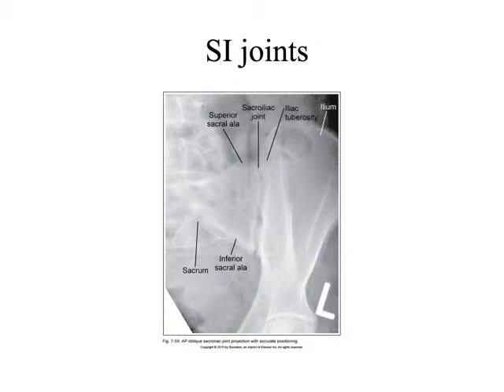In terms of this left SI joint, where is it at on the image? Can we point it out? Yes, you can point it out, but then use your words to tell me where it's at on the image. It's centered on the image. Thank you. Good. We have an SI joint centered on the image. The name of the game, I'll try to clarify, is to just describe what we're seeing on this picture.